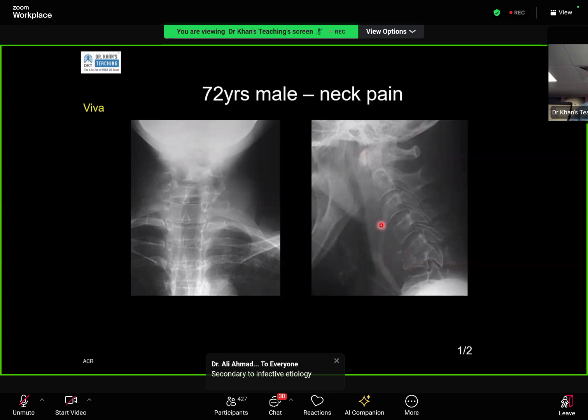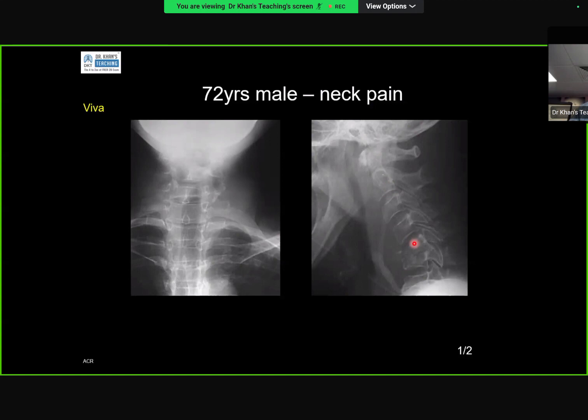This soft tissue anterior to the spine has various measurements. Distal to C5, it is about 2 centimeters. But another formula to remember is that distal to C5, it should not be more than the AP dimension of the vertebral body. There is a definite soft tissue abscess.